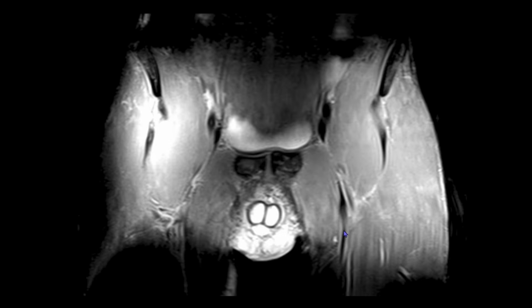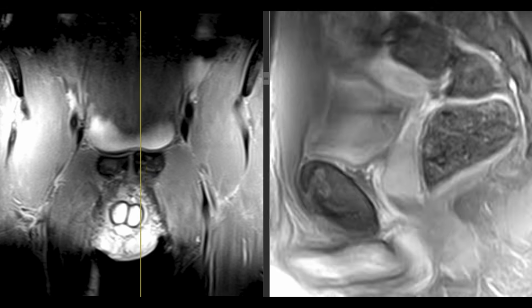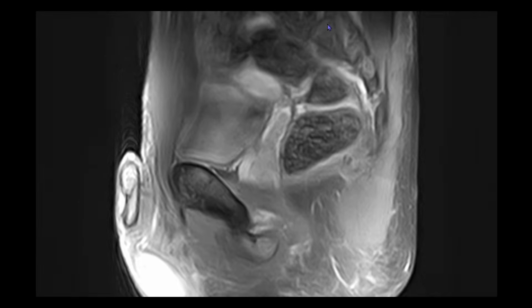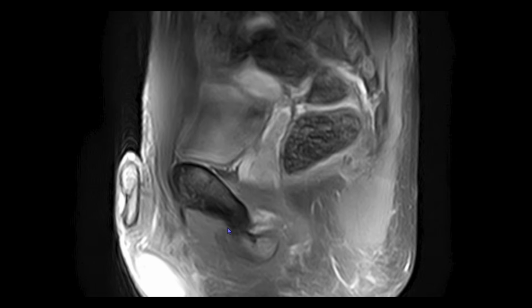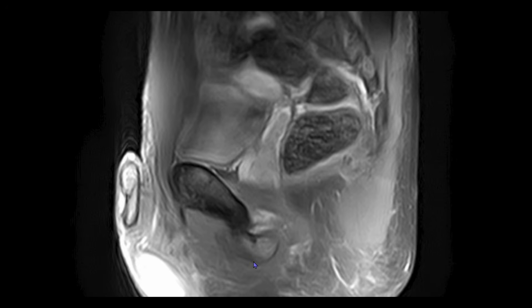This is a tear which is occurring at the common rectus abdominis and adductor longus origin. On the left side, no such thing is seen. However, just to be sure, we'll correlate on the sagittal images as well. Here in sagittal images, we are not seeing any fluid cleft. However, the delineation appears indistinct, so there might be a possibility of chronic tendinosis which might be occurring because of the strain in this region in the athlete.